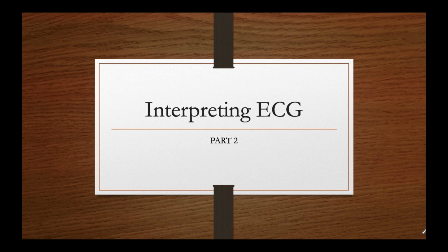Hello and welcome once again to another interpretation of ECG. Today we are looking at the cardiac axis, but if this is the first time you are watching this, I will encourage you to go back and watch the previous videos where we described in detail how to determine the heart rate of an ECG as well as the rhythm of an ECG.